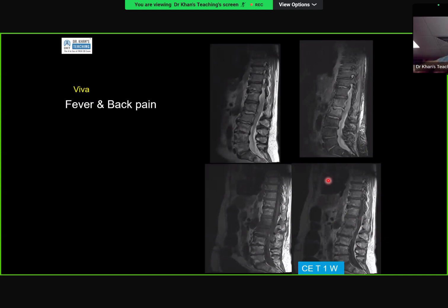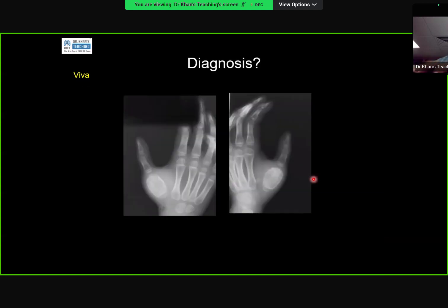Okay, now an Aunt Minnie case. What is an Aunt Minnie case? An Aunt Minnie case is where there is no differential diagnosis. In the 2B exam, the trend of Aunt Minnies is less and less because the examiners know that candidates have mastered Aunt Minnies. So an Aunt Minnie by definition is a case in which there is no differential diagnosis. But this is an Aunt Minnie case. What is the diagnosis? Can you describe and give me the diagnosis? Still you should know what it is.